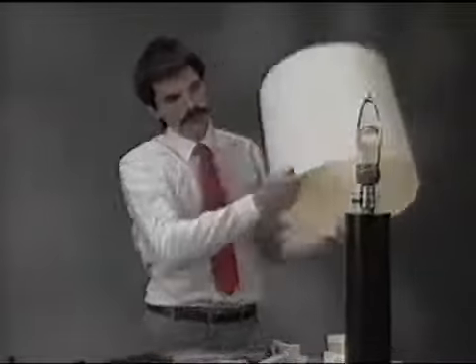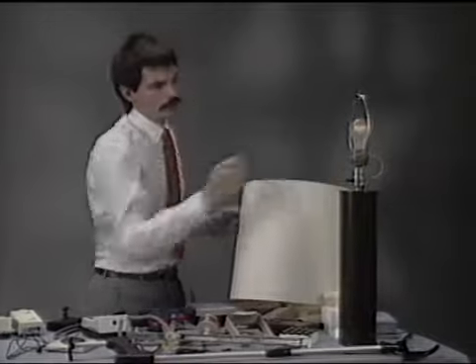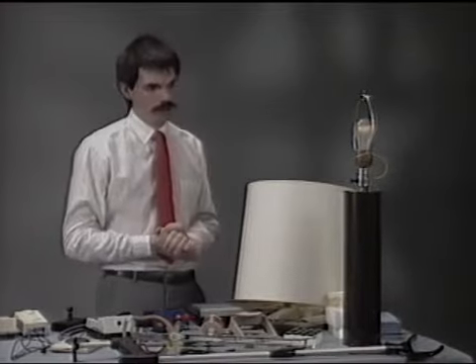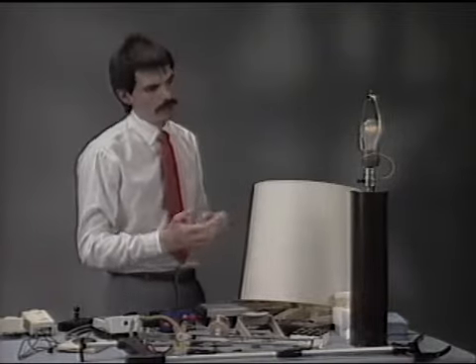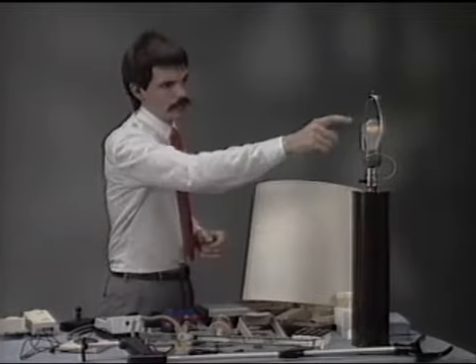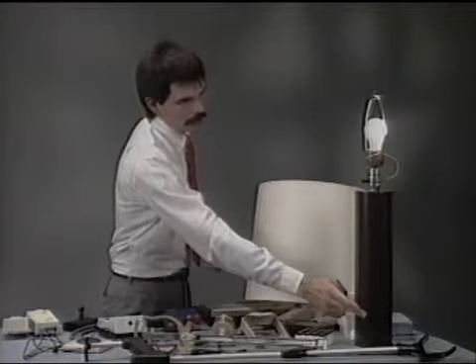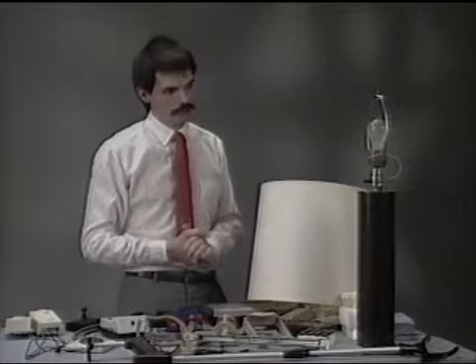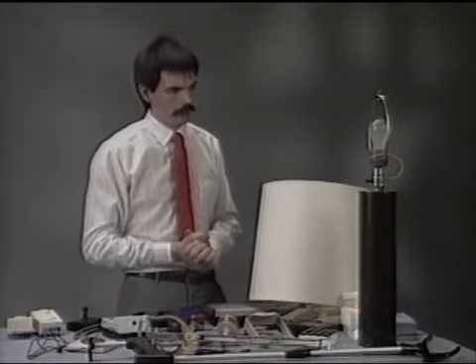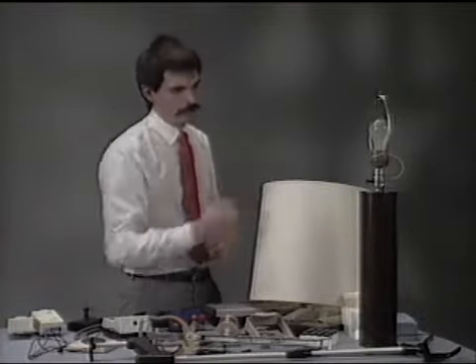Another type of environmental control would be like this. This brown piece here is a module that you can buy at almost any hardware store, and it usually goes under the heading "Your touch is a switch." What it allows is for this lamp, which is a regular lamp, that I've taken the light bulb and screwed into this unit, to become a touch-based lamp. Now, these lamps are sold commercially at stores like Sears and some of the large chains of department stores. However, if you already have the lamp and you want to modify it yourself, for about $15, you can add this piece.